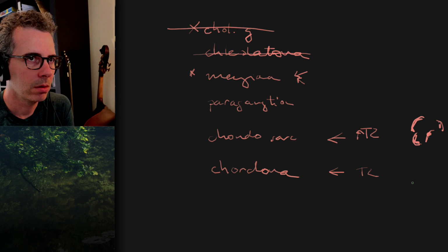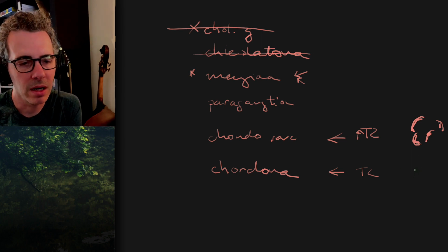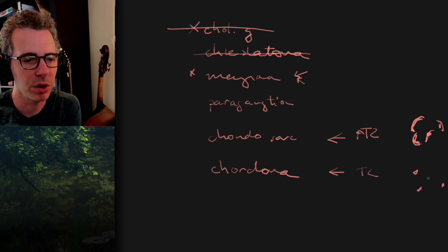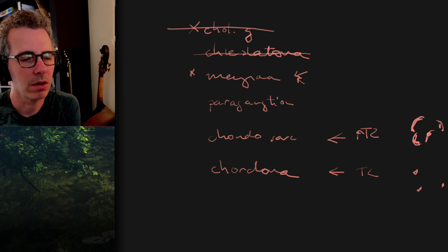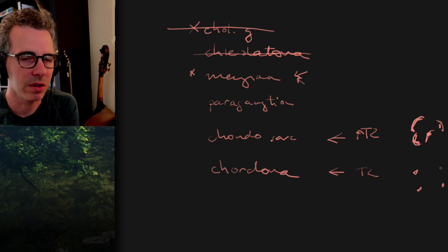Does it ossify or calcify? Can't recall precisely. I don't think so. No, it doesn't. But it destroys bone. Yeah, and it's aggressive. It can leave behind little spicules of native bone that it hasn't destroyed. So you might see little flecks of bone in it, but the bone's destroyed.